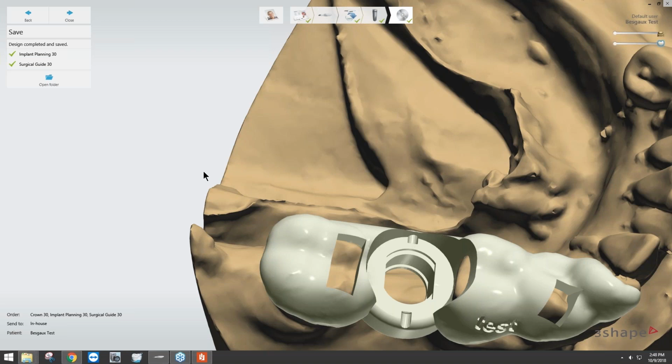Additionally, about the surgical guide design, the only real tools available for changing this design is with the addition of bars or cutout of windows. The software won't allow you to sculpt on the surgical guide because allowing something like that may cause other violations like minimum thickness and things like that. In terms of 3Shape's FDA compliance, they did have to limit a little bit some of the controls in order to get that approved.